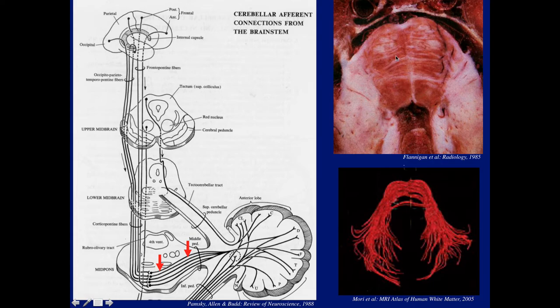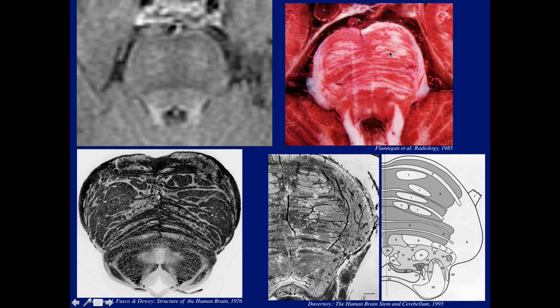And you can see on the specimen all these tracts passing, breaking up the corticospinal tract, these white little fascicles here. That's because of all the crossing fibers. And you can see again on the specimen here, the corticospinal tract broken up by these crossing pontine fibers.